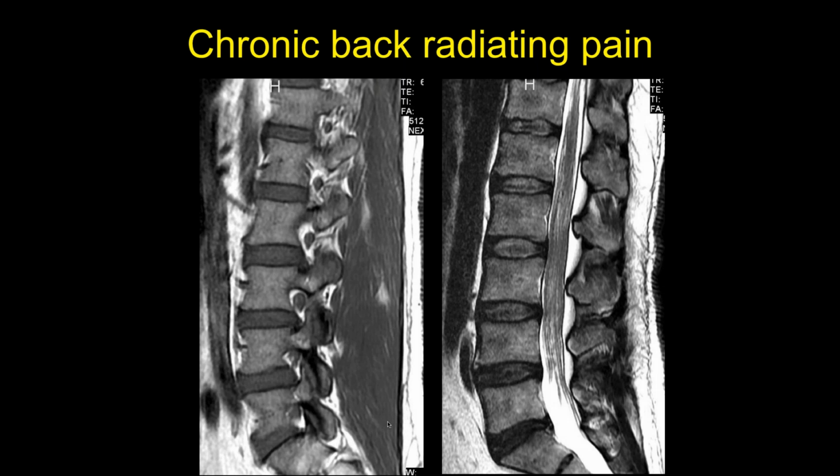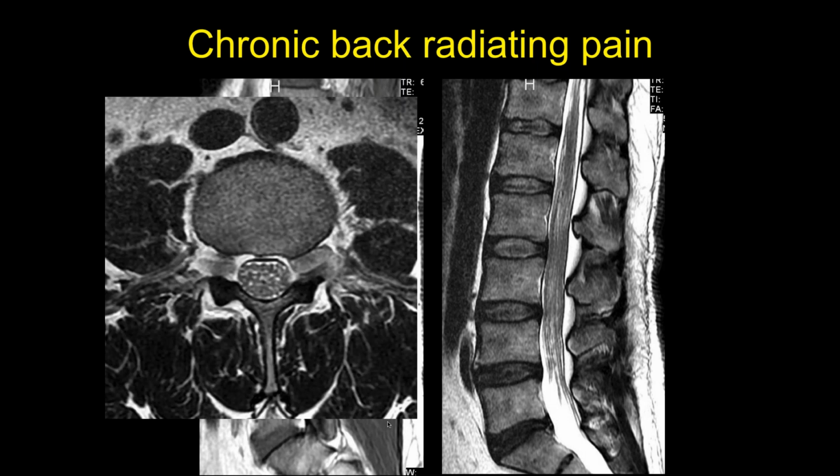Okay, here's a T2, and it looks like the nerve roots are thickened. Wonder if it could be arachnoiditis. Well, the sac is full of nerve roots in this axial view, and normally they should be in the dependent portion of the sac. I just saw on the left neuroforamina, it looks like there's a soft tissue lesion there. Maybe it's a schwannoma right there.